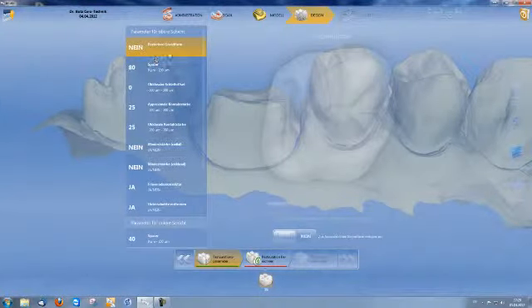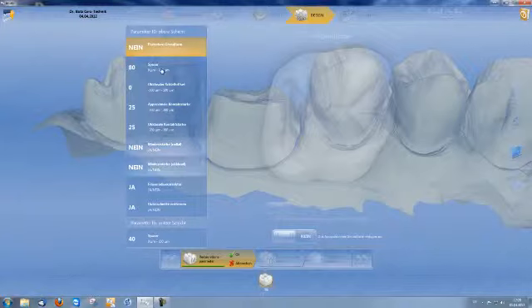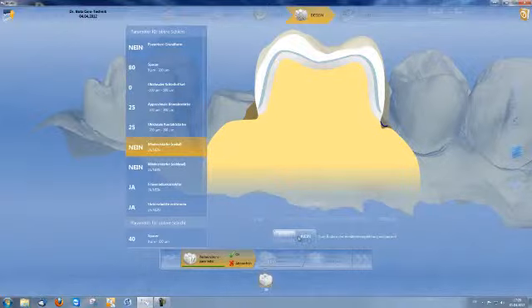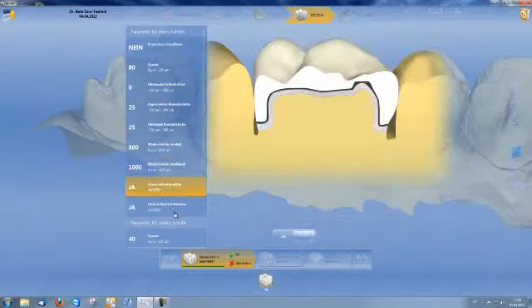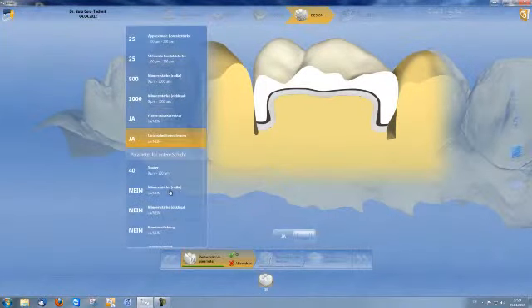The anatomy is determined here. At present, biogeneric is set. If a different basic form is desired, this can be set here. Spacer for the fit of the restoration between the zirconium oxide and the veneer ceramic. The minimum radial and occlusal wall thickness corresponds to the material manufacturer's recommendations. Milling radius correction for direct fitting and blocking out of undercuts.